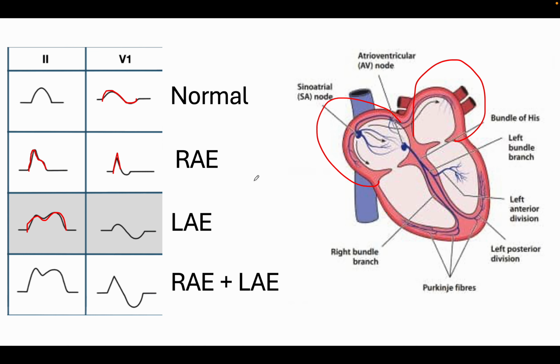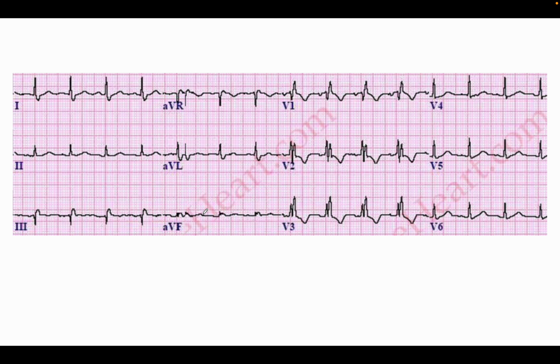So that's dissecting the P wave. So let's do some practice now. Feel free to pause the video, work out the ECG yourself, and then I'll pop up the answer and then we'll go through it together. So answer's popping up in 3, 2, 1, 0.